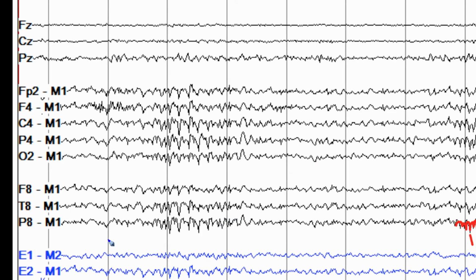If we look earlier in the page, we get a better sense of the mixture of 14 and 6 Hz discharges. Focusing in this area, we see that initially there are the higher frequency arch-shaped 14 Hz waveforms, but then there are broader waveforms that are at 6 Hz. These are sometimes notched in the middle, where you can see what is probably the remnant of the 14 Hz waveform. This is probably because of harmonics of two different waveforms which are superimposed on each other. And once again, it becomes easy to understand how the name 14 and 6 arose.